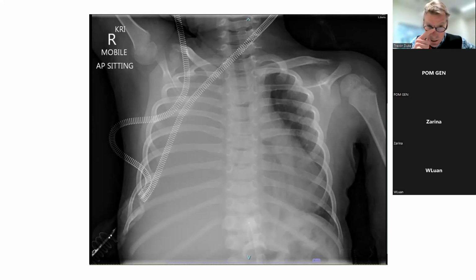Sometimes you can see the appearance of a whiteout of the chest and say it looks like it could be a mass because of the shape of it, but this is the entire thorax whited out, and it's much more likely that even if there was a mass there, then certainly there's an effusion there, and the effusion's probably quite large. So sometimes when you've got a solid structure or a mass, you can have both a solid structure and an effusion, can't you?